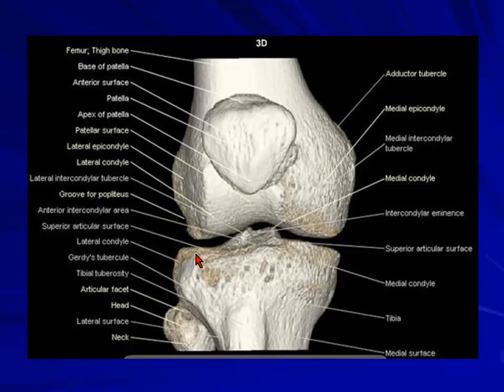We're going into the tibia. You've got the condyle here, lateral condyle, medial condyle. These are the plateaus. So when you are talking of abnormality here, you talk about the tibial plateau. There is either depression or degenerative changes or fracture. Then you talk about the medial or lateral plateau. If there is some pathology related to this margin, then you talk about the condyles.